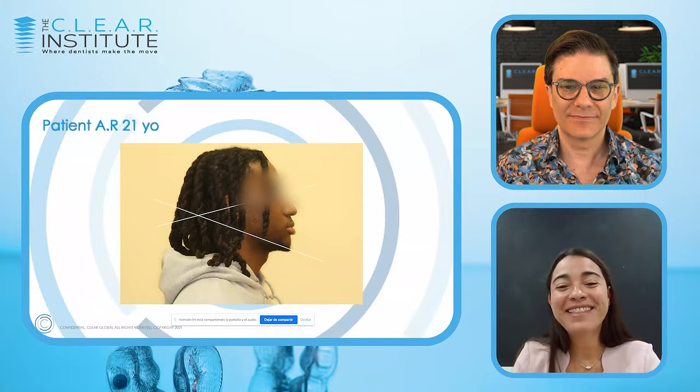Yeah, absolutely. Very interesting. We still didn't look at the teeth. Yeah, no teeth yet. We don't even think about the teeth. You're so good. This is the final image, and there is a facial axis, and the facial axis tells you about the vertical growth of your maxillary bones.